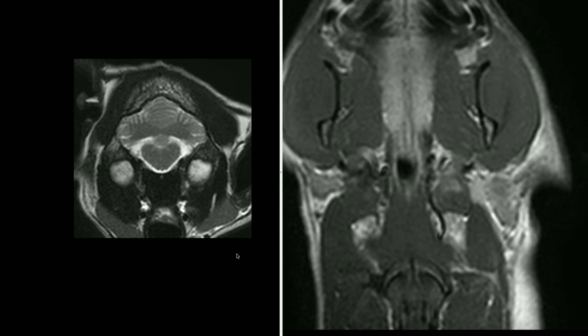The final thing that the MRI showed was something which we'll commonly see when we have facial paresis, which is denervation changes in the caudal part of the digastricus muscle, which is innervated by the facial nerve. Here we can see that there's asymmetry of the digastricus muscles, with the left smaller than the right, so we see it on multiple planes.